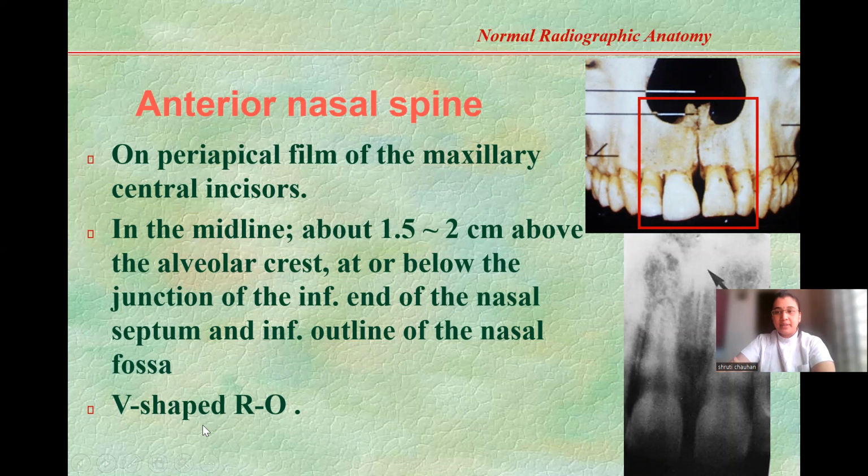Again, we come to the same thing. Why is it radio opaque? See, this is why I'm emphasizing this again and again. It may seem very boring to you right now, but when in the exams you're asked, what is the anterior nasal spine, you sit there blank. Why does this happen? Because you have just learned that it is here, this is that. But now you don't know if it's black or white, or why it's black or white. This is the basic thing. You have to know why it is black. You have to know why it is white.